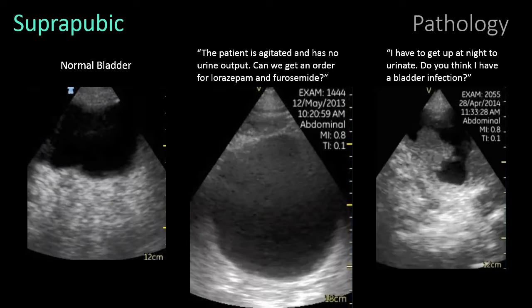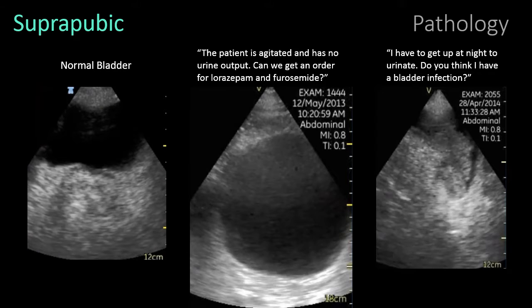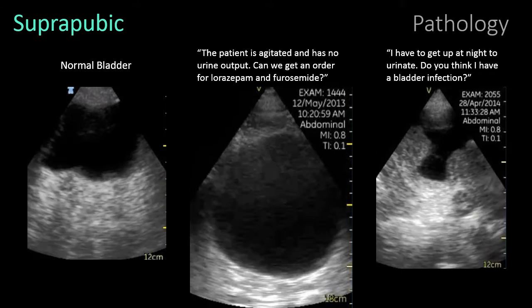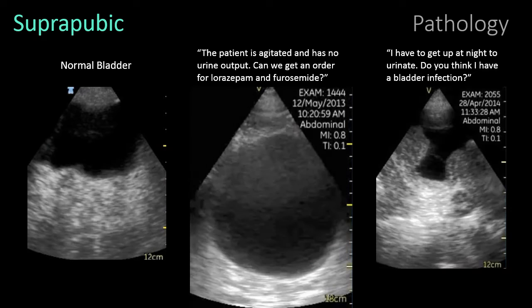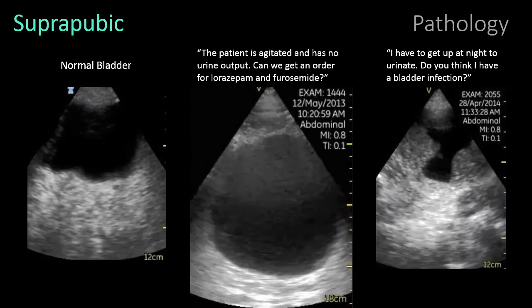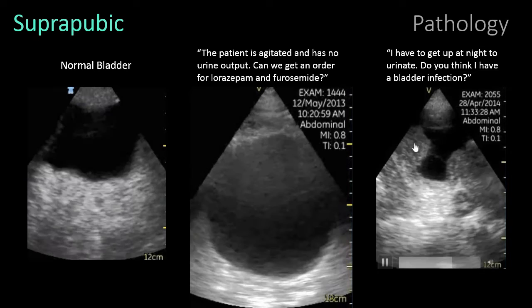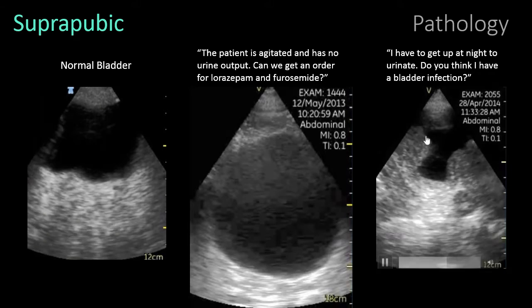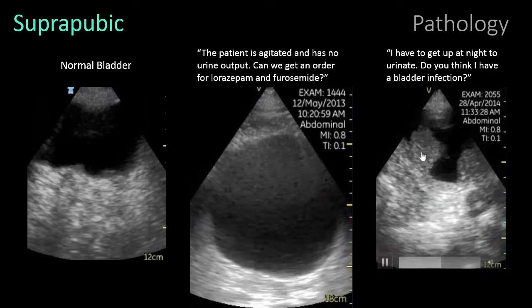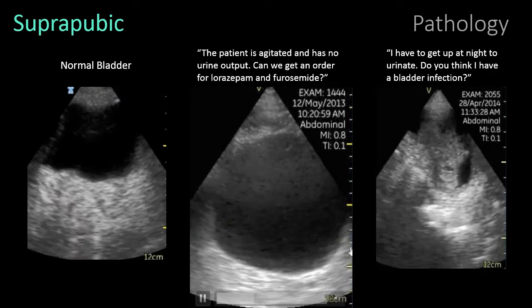On the right is a man I saw in clinic with fatigue and the common old man complaint of urinary frequency. Ultrasound of the bladder showed both his large prostate, which you can just see to the far right of the screen, a bilobed mountain pushing into the bladder, but also an irregular mass, which turned out to be a transitional cell carcinoma of the bladder, which was resected not long after that. And he's alive and doing well without further bladder cancer problems.